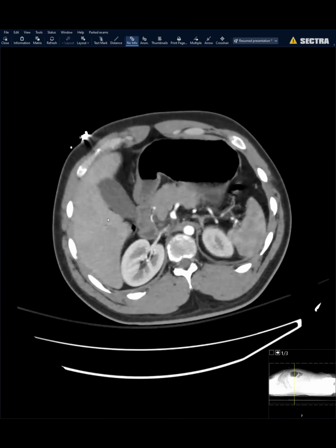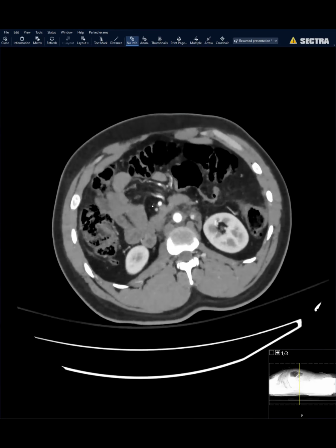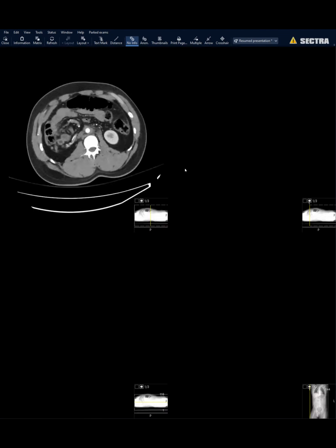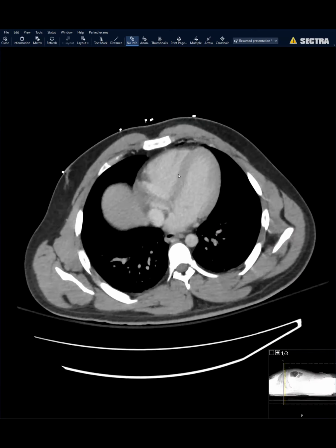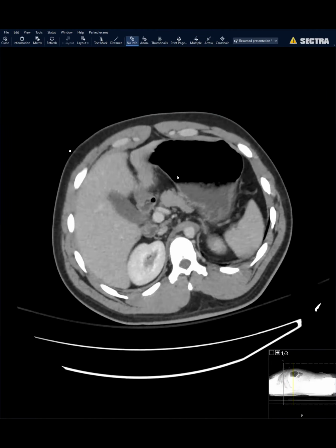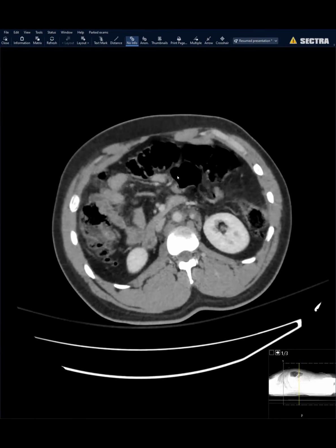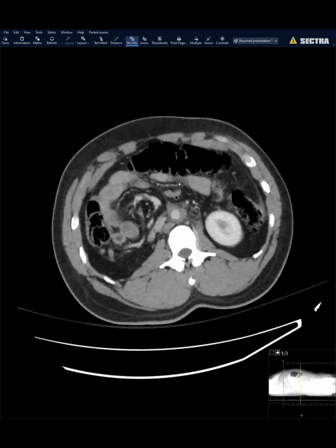We didn't see anything else in the liver. We didn't see anything in the duodenum. So I'm just going to scroll through the venous phase once and see if you guys can pick out anything which bothers you. There was something in the mesentery in the pelvis, right? And there was some free air more towards. Also, I don't like the stranding around the aorta.